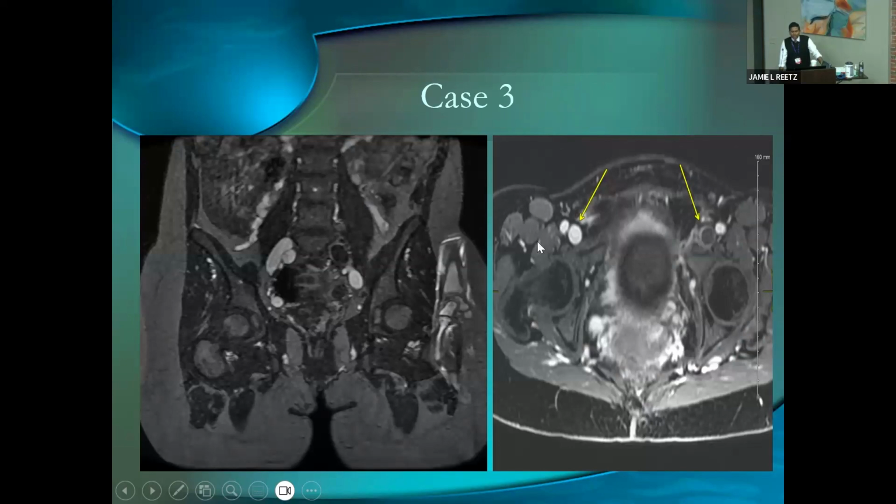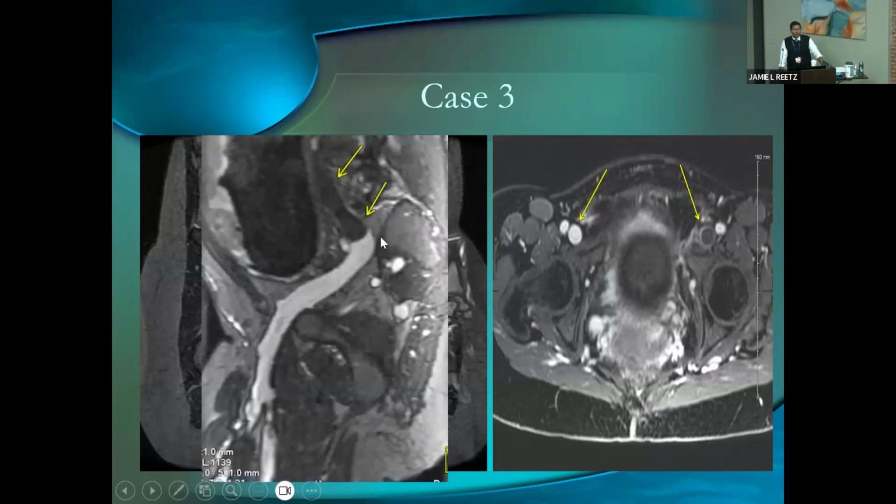So right here, you can see basically the very proximal common femoral veins going into the common iliac veins. There is thrombus. So one is dark, one is bright. And we can actually see, very annoyingly, the left common iliac vein. So the ultrasound was squishing here and saying everything looked hunky-dory, but the reality was there was thrombus more proximally in the left common iliac vein that actually did extend into the IVC, and this is why there's slow blood flow here, which means the blood is probably trying to circulate around this thrombus, but that's why there's a diminished waveform. That's why there's decreased phasic variation. And so we're like, holy crap.